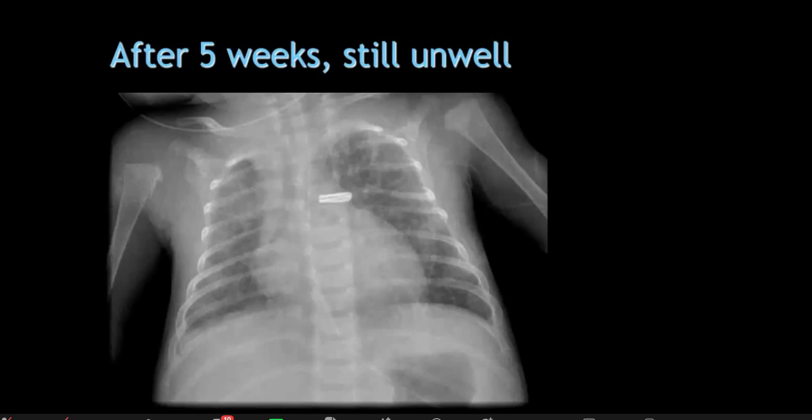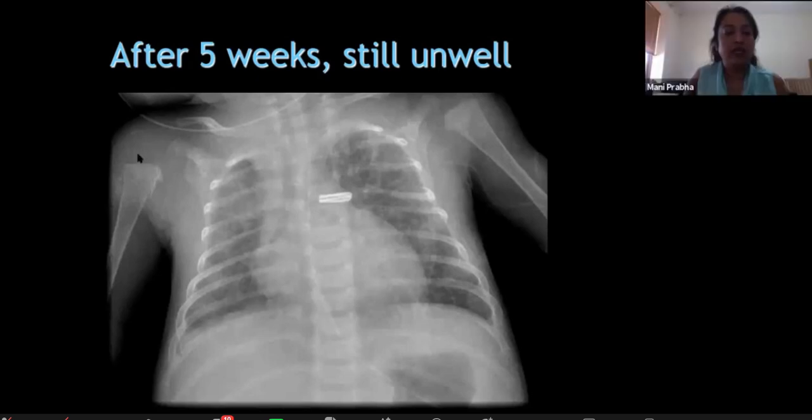Besides, in this 5 weeks old child, the humeral epiphyses are not still seen. They are seen definitely by 41 weeks, so the child has to be a preterm child. They may not be seen at 37 weeks, but they are definitely seen at 41 weeks most of the time. And there is some opacification in the lung in a preterm child. Bronchopulmonary dysplasia or chronic lung disease occurs due to ventilation. So that's what is going on.